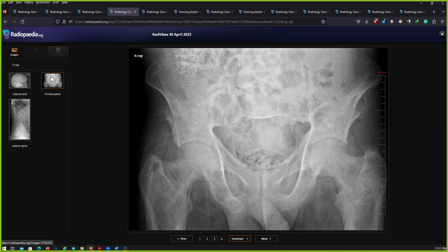Okay, ignore those. What about the bones, the pelvic bones? There is diffuse osteopenia of the bone with prominent trabeculation, secondary to the osteopenia, I think, rather than Paget disease, less likely Paget disease.